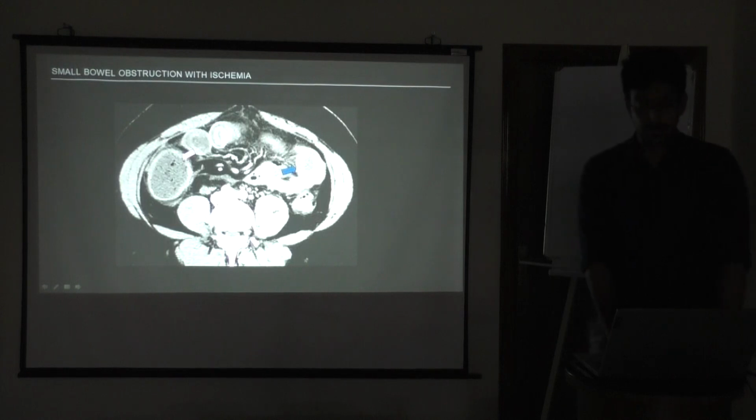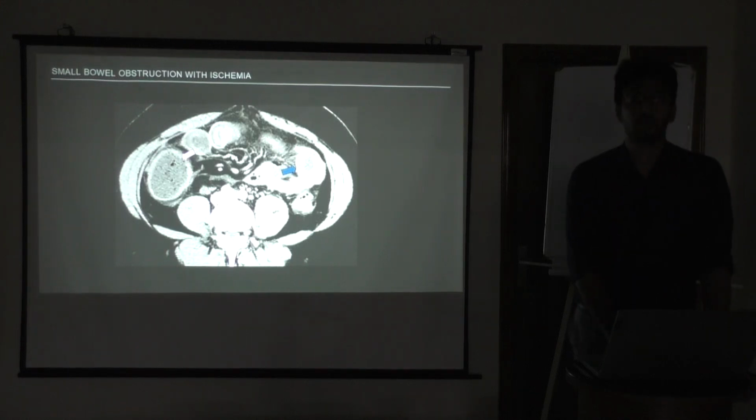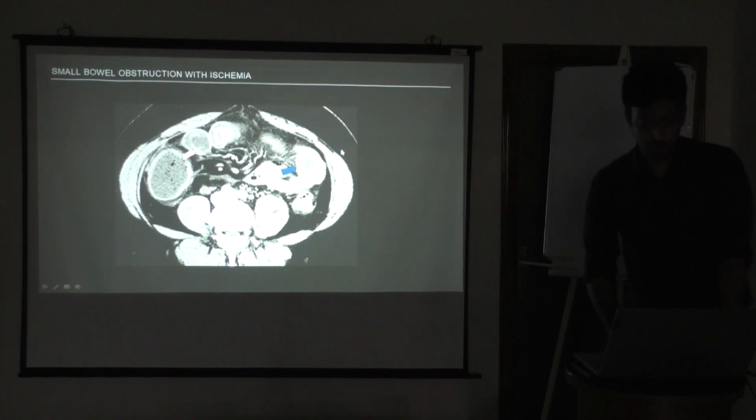The reason why it's a bit confusing, you can't always tell ischemia, is, let's say there is vein thrombus. When there is vein thrombus, obviously the contrast is not going out. There is no way, the outside door is closed, so the contrast will settle in. So there will be hyperemia. That doesn't mean the bowel is alive. It is so grossly engorged, the arterial supply is not coming, so there is not enough oxygenation. That won't survive, but still it will be hyperemic. So hyperemia alone will not tell if it's alive or not. So this is one of the most significant signs that you have to pick.